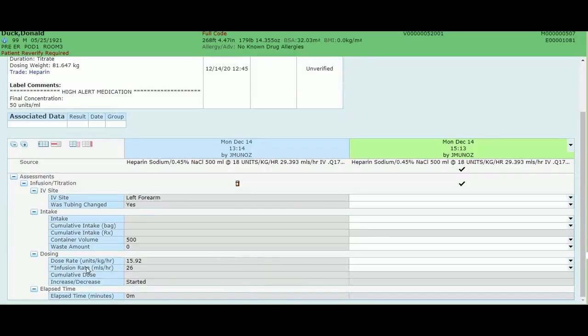So in your flow sheet, you're going to put your infusion rate as 0 and press enter, and that will autofill the rest, and it has a pause here. So the pause time, you can adjust this to the time that you actually pause the pump.